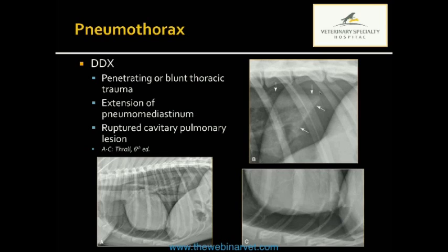That might include an abscess with gas-forming organism centrally. It might be a tumor, again, with a necrotic center. More commonly, we may think about bulla or blebs, which are purely air-filled cavities. Oftentimes, even if we do see those on the radiographs, we don't know exactly who's the culprit, but those are just some differentials to consider. And then our hallmark radiographic finding is going to be retraction.